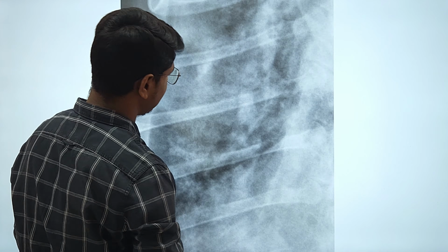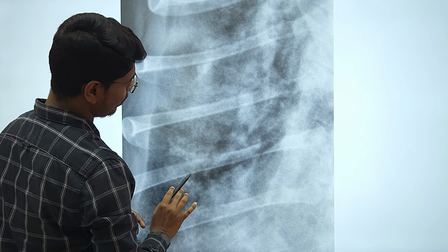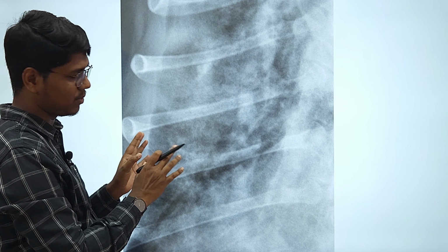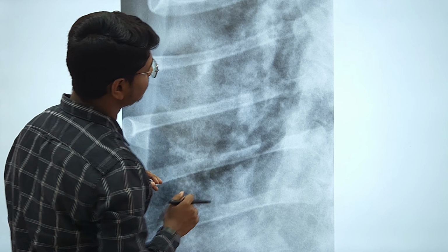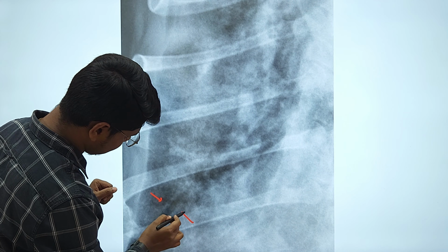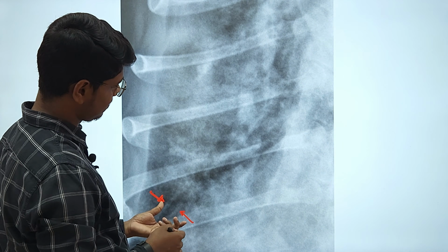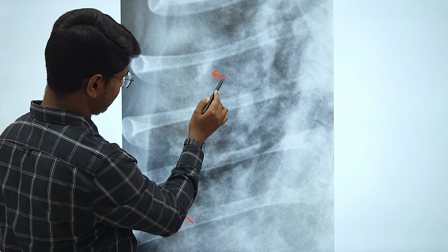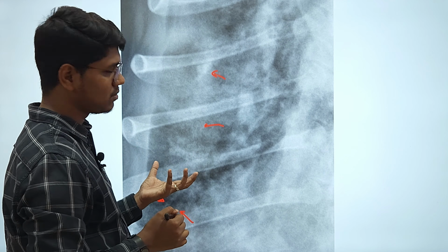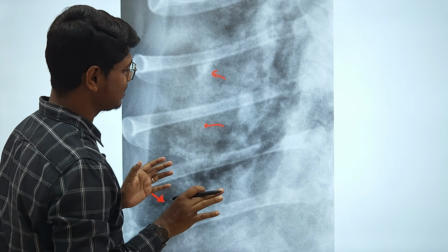Let us see some other radiographs. Here, this one is slightly more intense. It is related to a kind of alveolar pattern, not the unstructured one. But can you see some? Let me show you here. This one is the tram line. This is basically the bronchial pattern, and you are also finding these intense areas, which are basically the alveolar pattern. So this one is the mixed pattern. You have to diagnose based on the clinical signs, and treat accordingly.